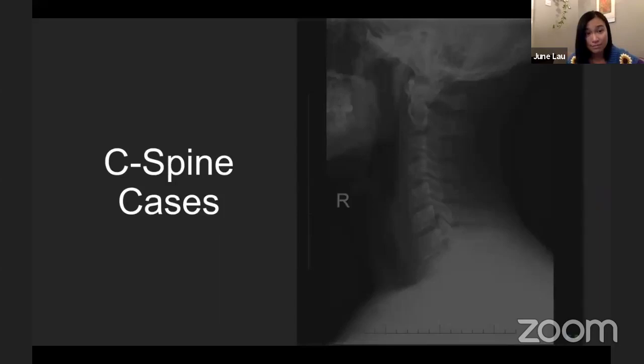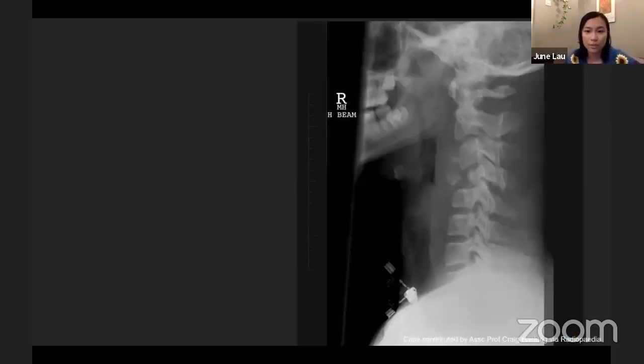And that's it. So that is how you look at a C-spine with the ABC2S method. Now, what I'm hoping to do is go on to some cases. So what I'll do is I'll show the pictures, and then if you can kindly type your answers in the question box, then we can go through them.